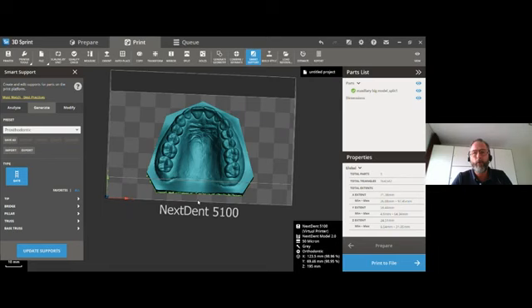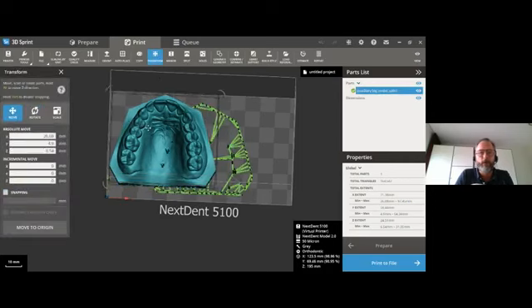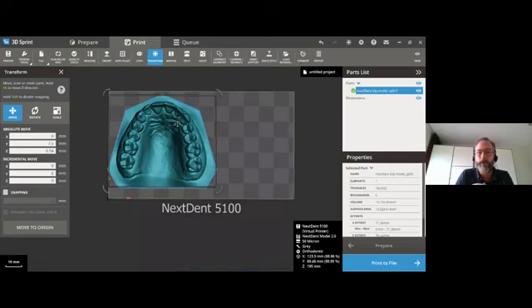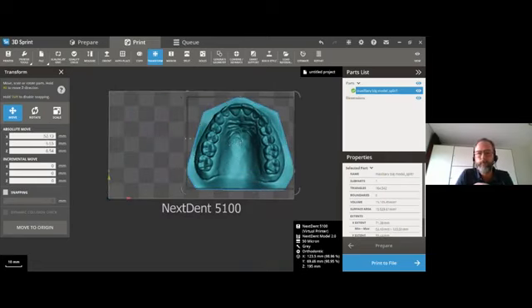But from a printing point of view, it doesn't matter if you orientate the part to this side. It will not do anything in regards to print quality. So yes, if you have several parts, it doesn't matter. They should all be the same accuracy after printing, of course. That is great. Perfect. Still one more question, or I think it will be the last question.